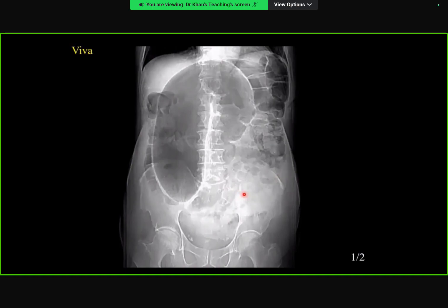Excellent, well done. Conclusion. As this patient has got a volvulus, I would relay the findings to the clinical team. Which kind of volvulus? I'm trying to hear which part of the bowel you are talking about. Sigmoid volvulus. Excellent. Okay, well done. I'll take over.